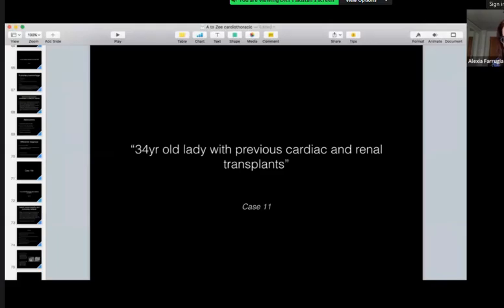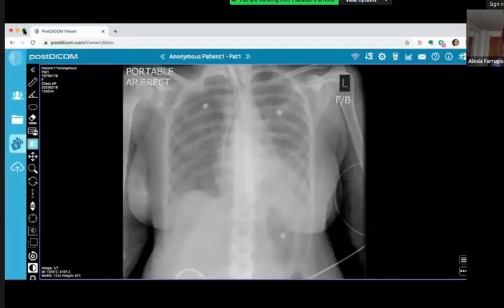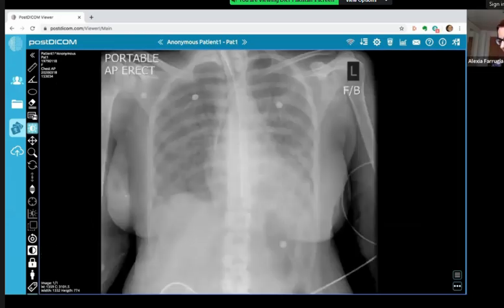Let's bring up her imaging. So we'll start with her chest X-ray. I will window it a little bit for you. I think you have to change the screen back completely. I'm going to share it now. I was just windowing it a little bit. Okay, can you see it? Just the X-ray now? Okay, great. Whenever you're ready, have a look and go for it.